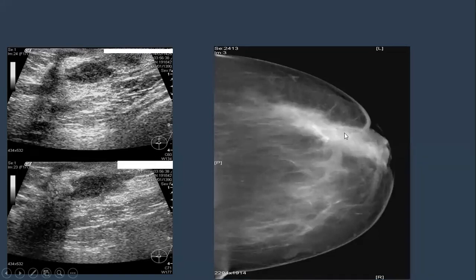The tract is coming and tethering and causing retraction by pulling and adjacent thickening. So what is tracking toward the nipple, long standing and with pus discharge? Could it be a fistula? Yes, a cutaneous fistula.